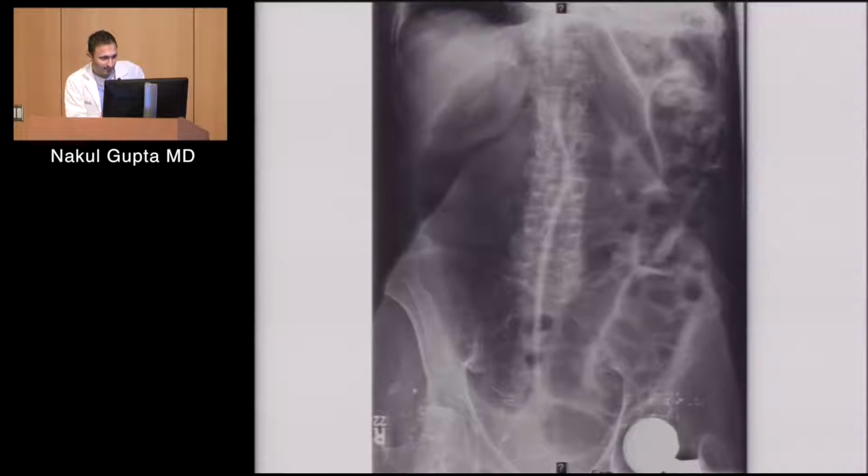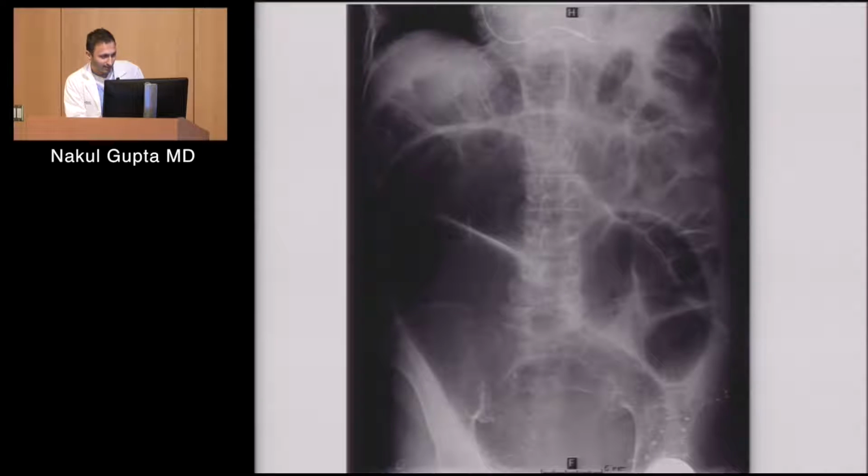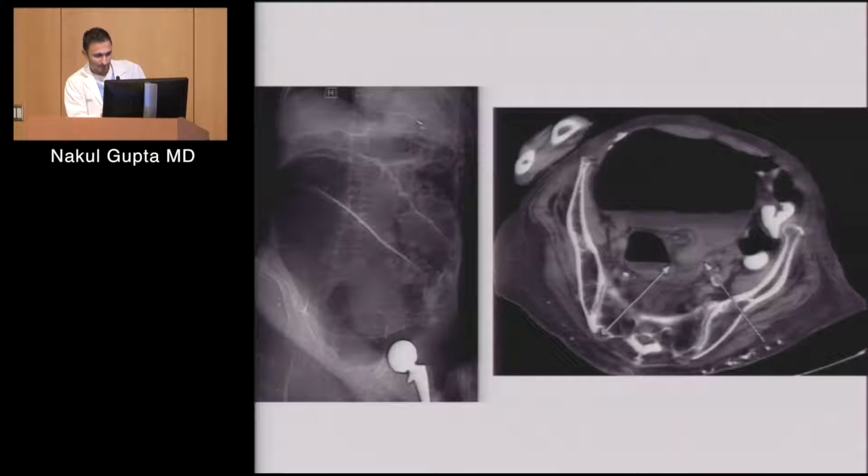Let's see. Let's go to the next slide here. Okay, this is a different patient, same disease. Take a look. Oh, actually, sorry, same patient. He has the same, yeah. He's been shot too, so it's probably the same patient. Yeah. So same patient. Okay, so, whoops, let's just stop here. Okay, so let's keep going.